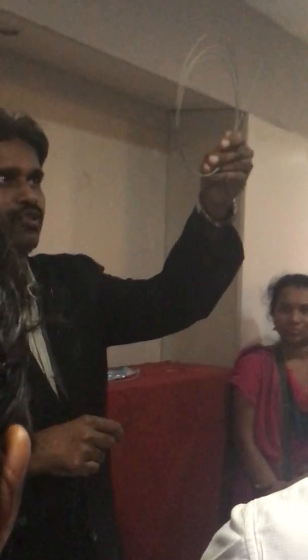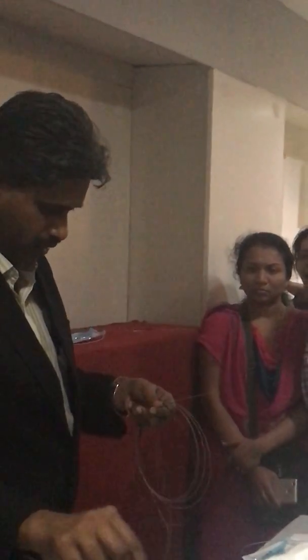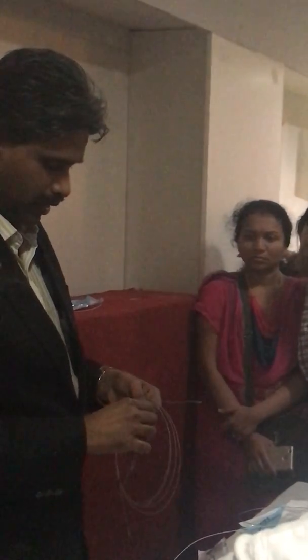Okay, and what are these wires? This one looks a little stiffer, it is Amplatz wire. This Terumo will be very soft. Amplatz will be very stiff, and in between you can call it a Teflon wire, or nowadays called a Rosen wire. Even if you say Teflon, it is fine. So these are the three common guide wires.